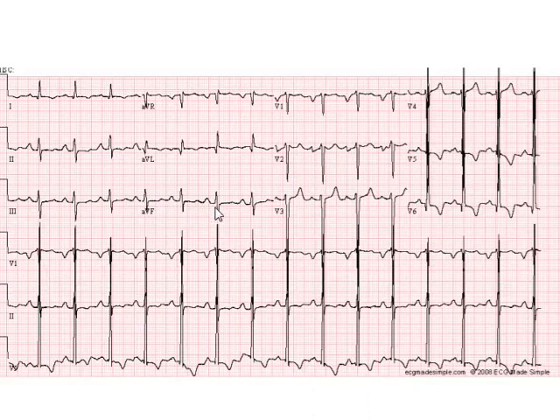respiration. On average, however, the R wave and S wave are about equal, suggesting that the axis is perpendicular to AVF. The axis is thus 0 degrees, which is normal. Because the QRS complex is narrow and sharp, there is no evidence of any intraventricular conduction delay.